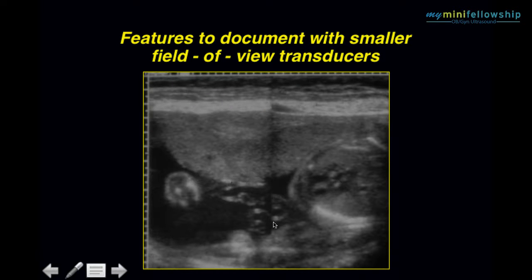Now, those were special large field of view images, but you can do this with a curved array scanner. You can do it with side-by-side linear scans. All you really need is to put together a picture which shows you that the torso fills the cavity from front to back, and there are communicating pockets of fluid between the small parts. That's it.